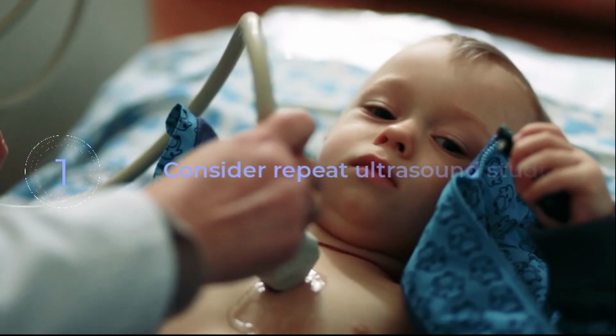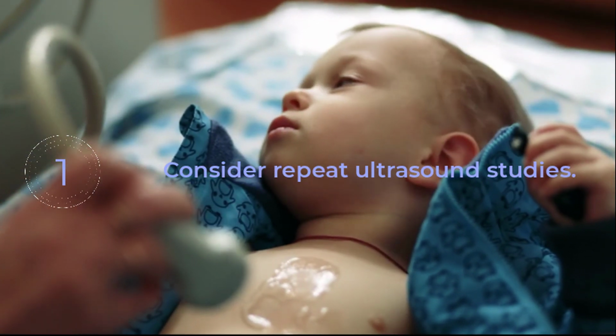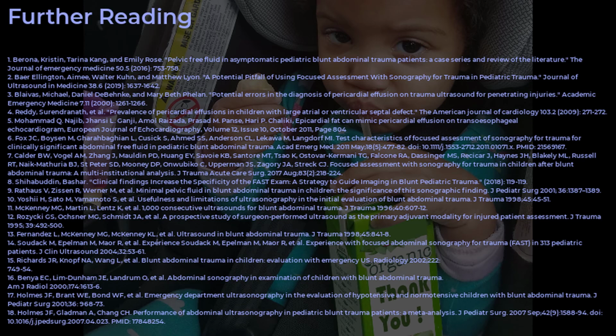Blood may not be visible initially, so repeat ultrasound after a period of observation is a valuable addition to your first assessment. If you wish to read further on this topic, a list of references is provided here.